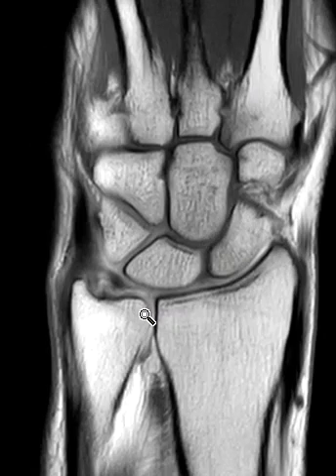I always start out by saying if the ulnar variance is neutral or positive or negative. So the ulna should be a little bit proximal to the distal radial articular surface. This is kind of borderline. It's slightly more distal than I'd like it to be, but it is about within normal limits. Any further, it's a positive ulnar variance, which means there's not much room for the TFCC to go through there. And when they have that, the ulna can abut the lunate bone here and pinch that TFCC.